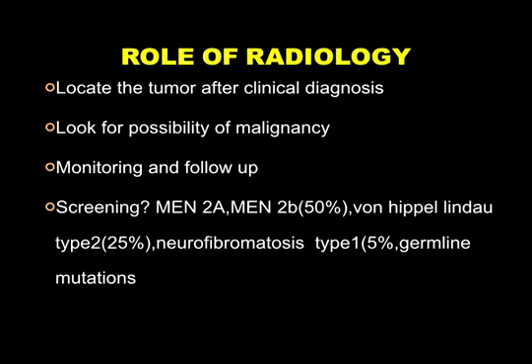Where is it located? 90% in the adrenal glands and 98% in the abdomen. The extra-adrenal sites take up the 10%, and that's the organ of Zuckerkandl at the level of the inferior mesenteric artery, the sympathetic chain, so we look along the aorta. Yes, the mediastinum. I want to look at the urinary bladder as well for extra-adrenal sites.